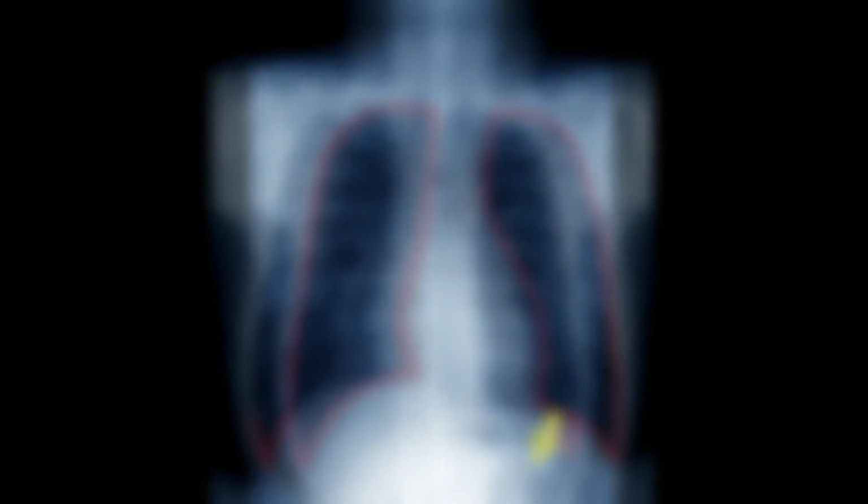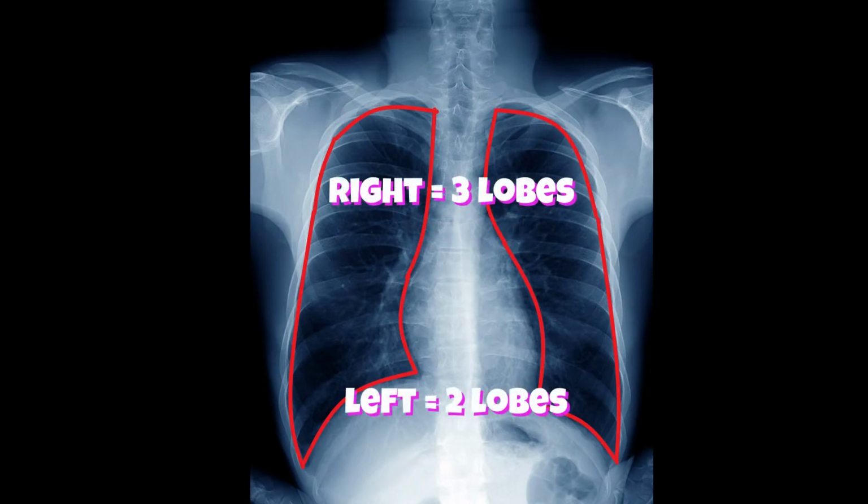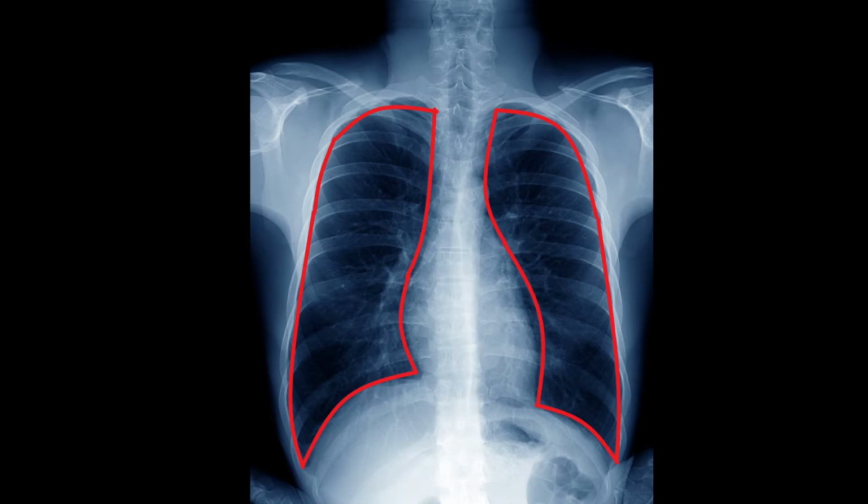The next step in the interpretation is to identify the different lobes of the lung. The right lung has 3 lobes, the upper, middle and lower lobe, and the left lung has 2 lobes, the upper lobe and the lower lobe. There are a range of different pathologies that could be identified by examining these different areas in detail, such as the presence of consolidation, the presence of suspicious masses, and also the presence of a pneumothorax.